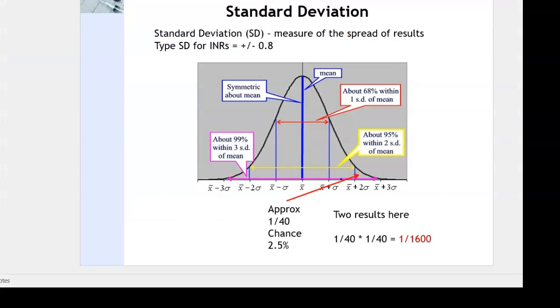So to summarise, using our standard settings, if a single INR falls outside one standard deviation from the target, Dawn will suggest a dose change straight away. Within one standard deviation from the target, Dawn will require either 2 out of 3 INRs to have been out of range, or 4 out of 5 previous INRs to have been outside a narrower standard deviation based on the results from the best controlled patients.